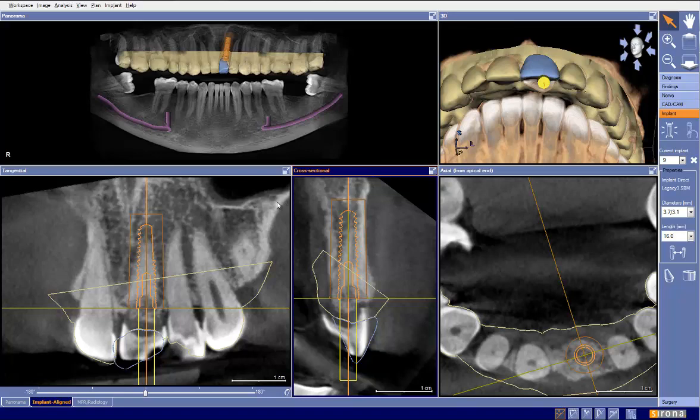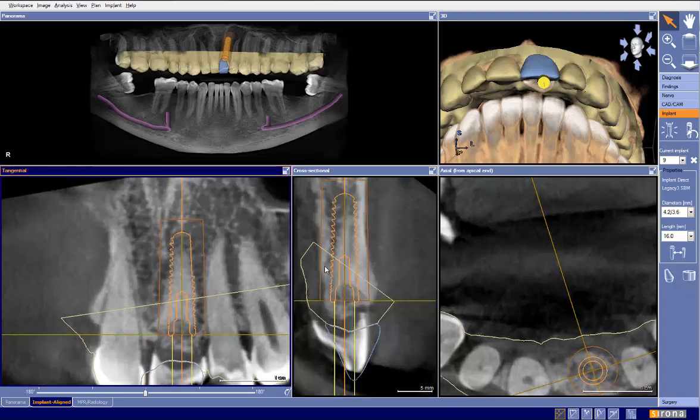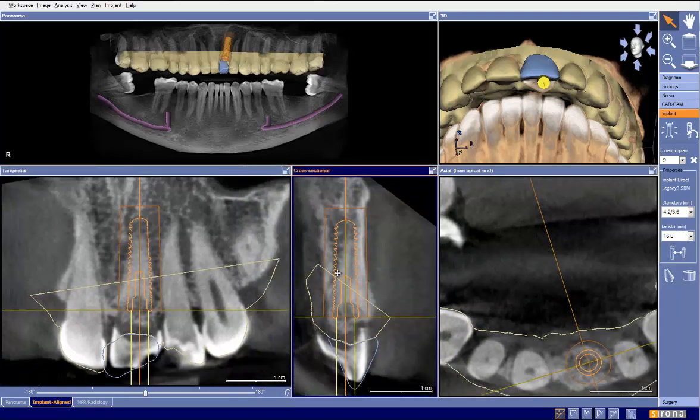Now, me personally, I'm always a big believer in giving it a chance. So I may make a plan to do the implant and then have to make a game time decision, maybe have to punt and determine that this isn't the better situation. Another option is, could we go to a wider implant? Now when we get into a wider implant here, we can see that we're going to start engaging bone a little bit sooner, but we also have to realize how thin we're making it on the buccal plate here.